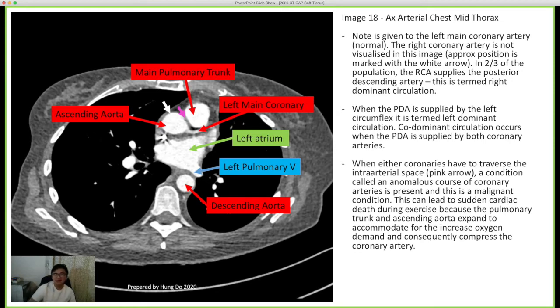There's nothing fixed, but in general, they're the general locations that in my experience you find them. The left main coronary becomes the left anterior descending, the LAD, and then the LAD forms your diagonals. Your right becomes the right coronary, and then your marginals.